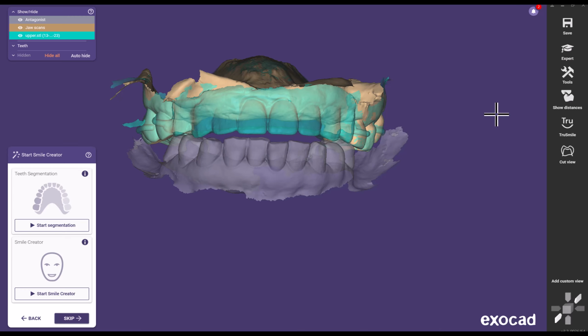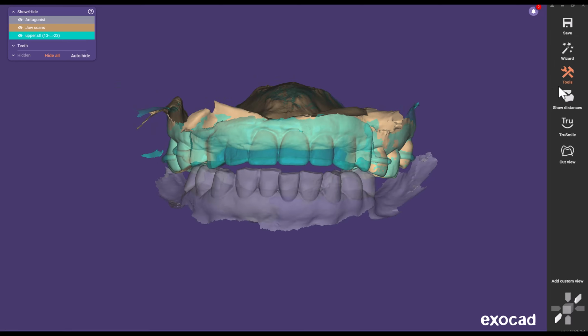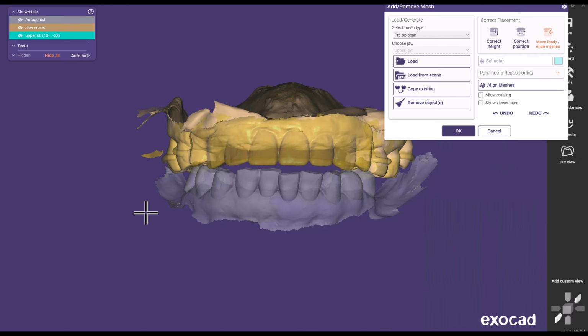I'll jump back to the wizard. Oh, you know what? There's one other thing I want to do. I believe that they've got facial scans here, so I'm going to try to bring that in as well.